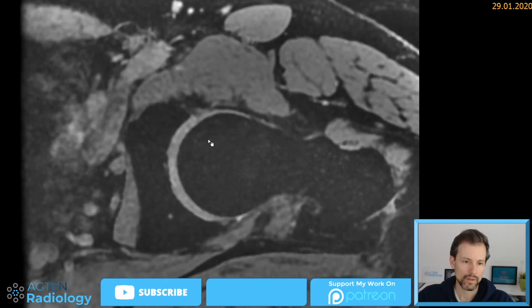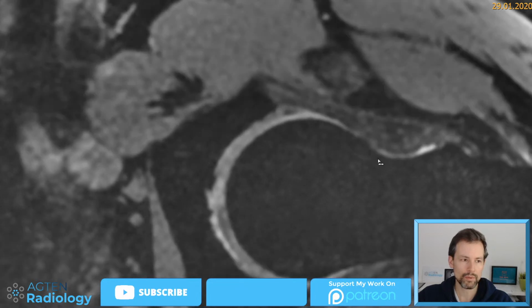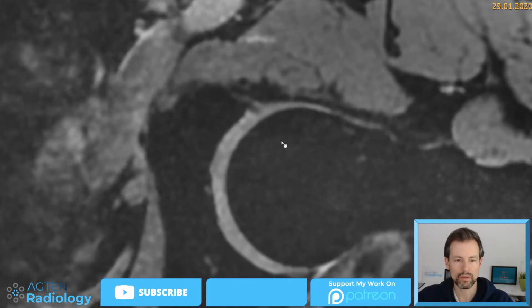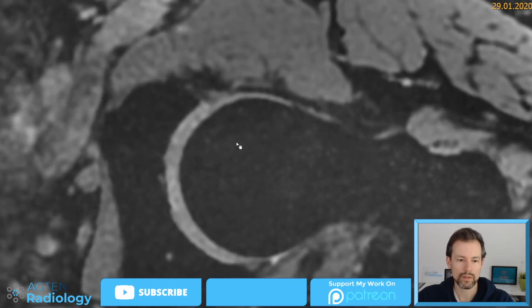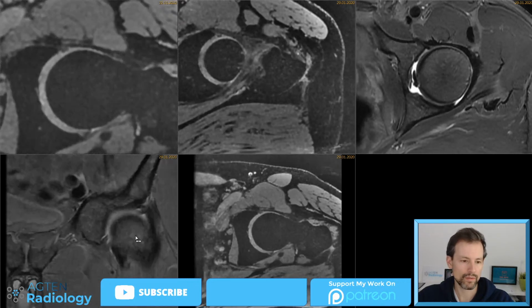So I think prospectively I wouldn't call this. Again, what I would probably say is just there are no deep cartilage defects. And remember, oh, I said it wrongly. So this patient is clearly over 50 years old, so just to keep that in mind. We would expect some kind of cartilage degeneration at this time anyways. So I would probably just say, okay, there are no deep cartilage defects on the femoral side of things, no subchondral bone marrow edema, and not really comment on very tiny superficial changes or just degeneration of the cartilage. It looks not too bad.